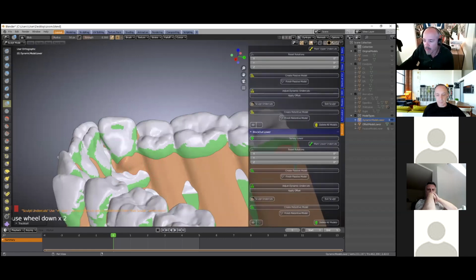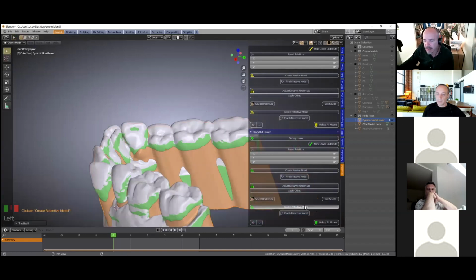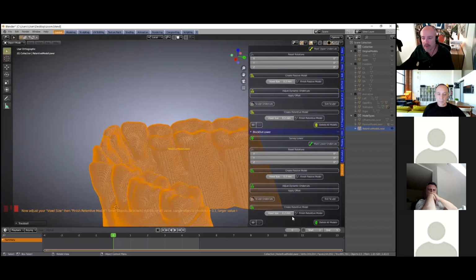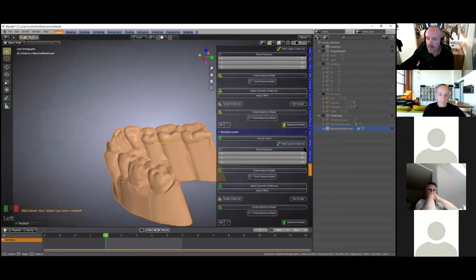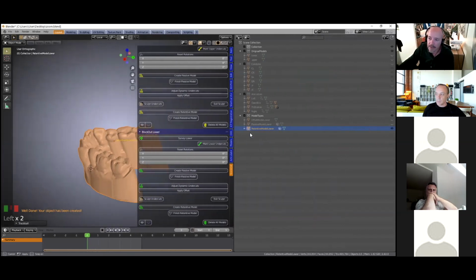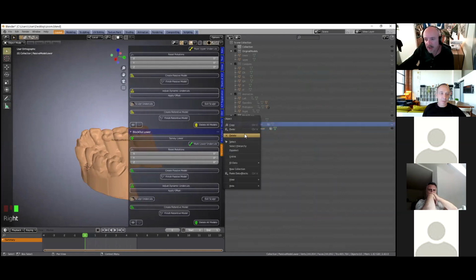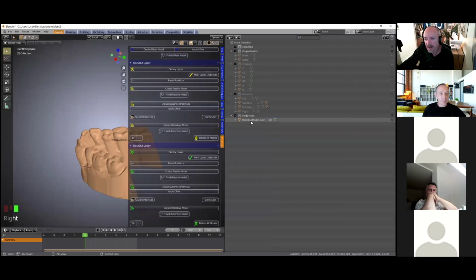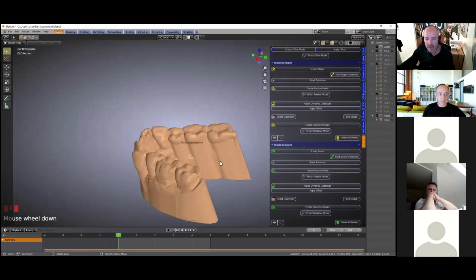And then from there, we exit the sculpting mode, and then we're going to create the retentive model. And this joins the orange model with the white model. And we're going to finish this model. All right. So here we've got 3 models that have been made. We're going to choose one. So we're going to choose the retentive model. The other ones I'm going to delete. We don't need them. The reason why I'm deleting them is to make space for Blender, because we don't want it to slow down.